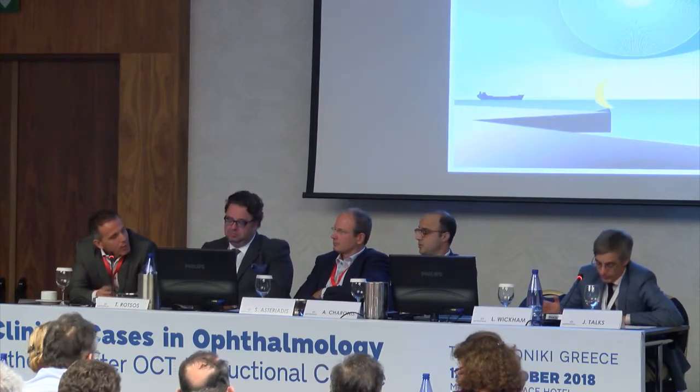Well, talking about the ischemia, James, I think there's a discrepancy between how you measure and quantify ischemia. I noticed most of the pictures were Optos. It's completely different from the number of ischemic areas that we used to calculate before. Yeah, I'm afraid it's a bit subjective. How do we measure it? It's much more than 10 disc diameters. You can take 100 disc diameters if you look at the Optos closely enough. So I don't really know the answer to that, but by looking at the whole picture, you certainly can get an idea of how much. But exactly the correct amount, I'm less clear about.